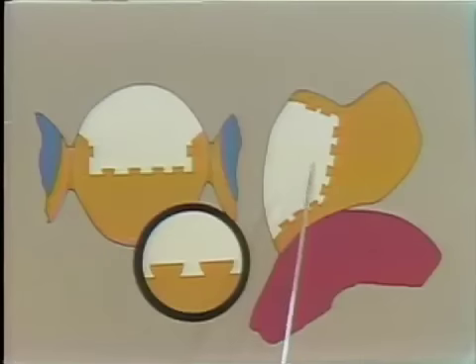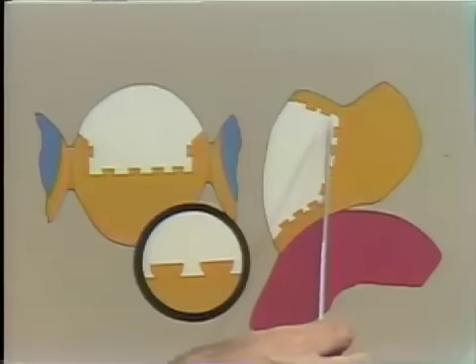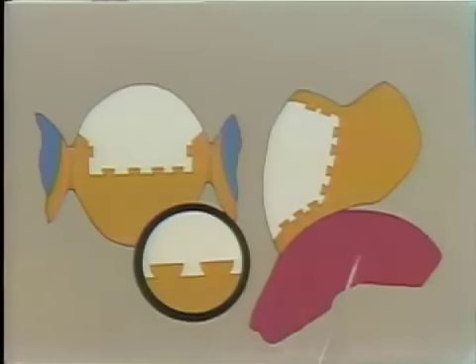The resin is held in position, is retained by these retention beads which you see around here. They're added at the wax pattern stage, and after the casting has been formed, the outer part is ground off flat here just to retain the retentive area here and to give maximum space for the resin facing.